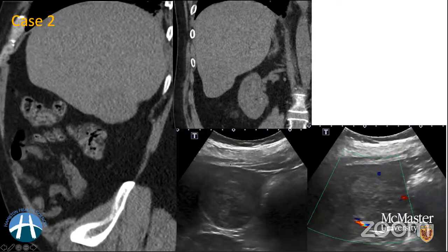So on ultrasound, you can see a mass there. I will let you have a look at the mass, see what it looks like on ultrasound, and then you can type your differentials, what you think this particular mass can be. And remember, just a healthy individual walking into the ER with features suggestive of obstructive uropathy or some renal stones, and this was just an incidental finding. So you can type your differentials. What do you think this mass can be?